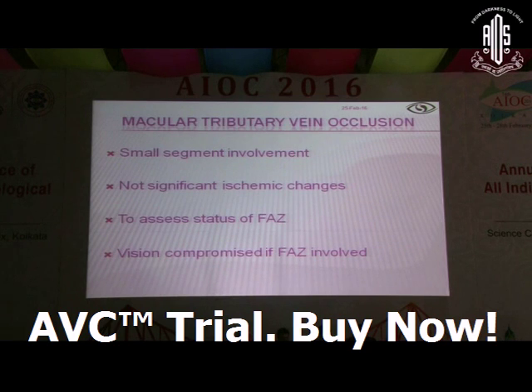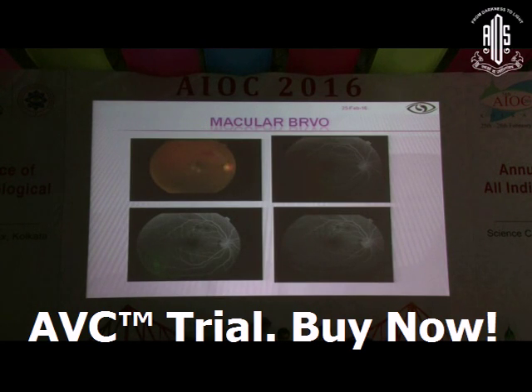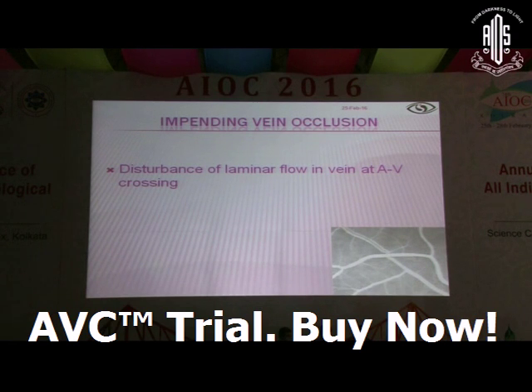Now coming to the very basic macular tributary vein occlusion, it's a small segment, and usually most of the cases do not show much visual loss. But angiograms are done whenever there is a loss of vision and if we are suspecting an edema, because with a small ischemic area, you can tell the patient that the prognosis is going to be slightly better. Very rarely, an impending branch retinal vein occlusion can be picked up by a laminar flow, and usually you will see that the veins occlude at the AV cross junction, and this is a classic example.